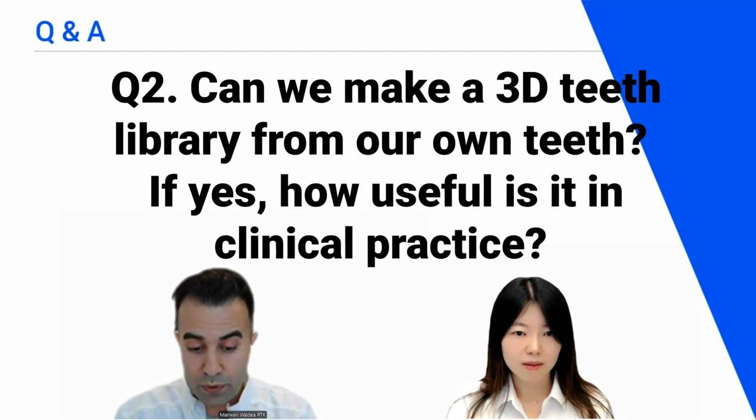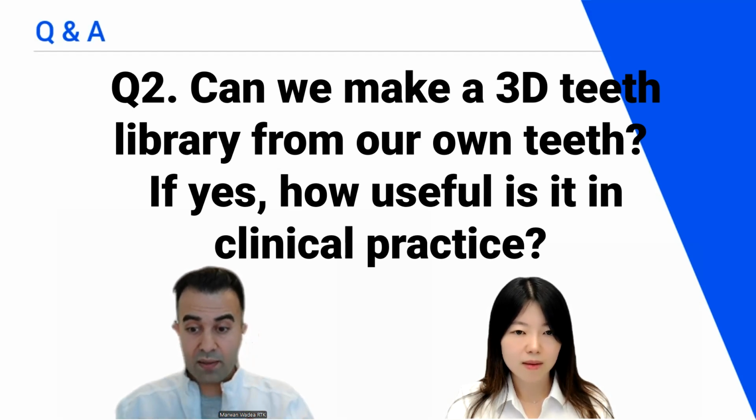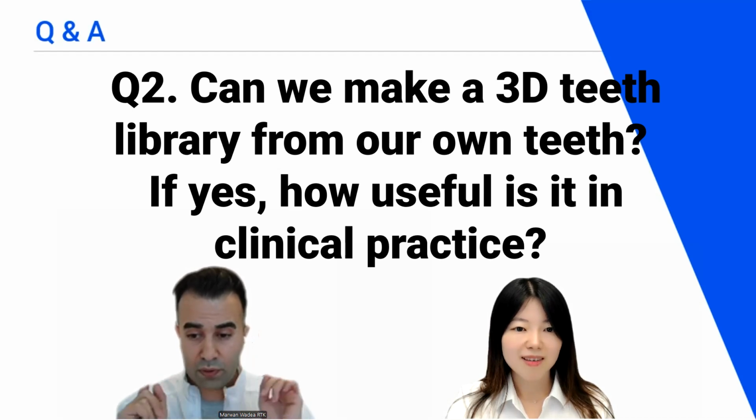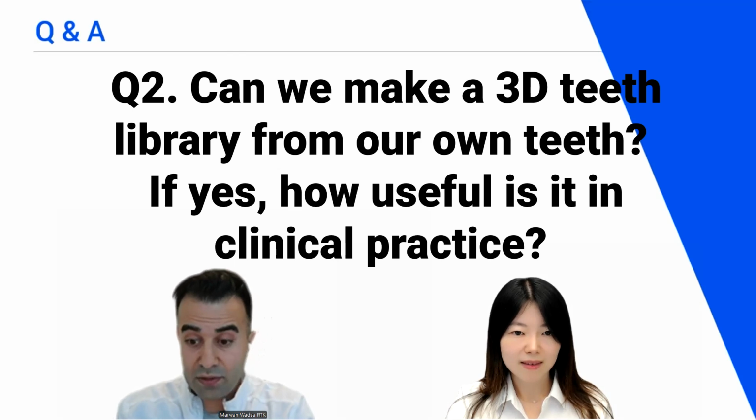And the beauty of digital dentistry, the power of digital dentistry, is symmetry. We understand left and right, we want them to be symmetrical to a certain degree, especially with the canines and the premolars, while the centrals have to be 100% symmetrical. And in the past, we would recommend for a patient to get 2 veneers. We would recommend even numbers, because to copy every single corner from one tooth to the other by hand is quite hard. However, with copy and mirror then paste, that would make it possible.